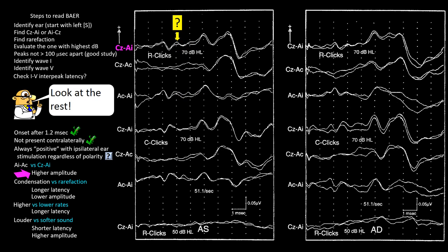So this item does not support the wave that we're looking at being the real wave 1.